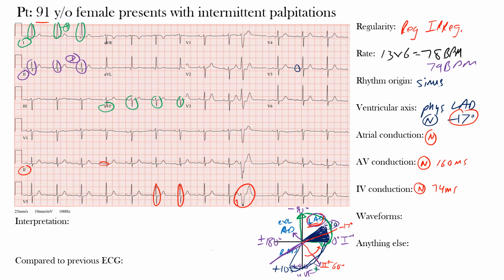Generally, the T wave amplitude decreases with age and tends to be lower in females than males, and it is typically considered abnormal if it's less than 10% of the R wave amplitude. Now, the T wave amplitude is typically greatest in leads V2 through V3, and on average is 0.3 to 0.4 millivolts in adult women.